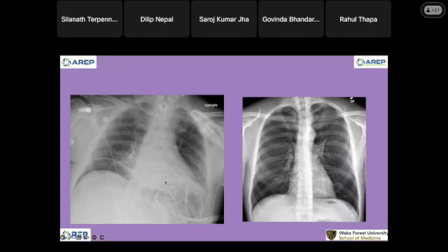There's no more left lung, and you can see the bronchial stump. A big air here. So this is our diaphragm, and then it's cut off. This is our diaphragm, and then there is air underneath the diaphragm in the belly. And the usual post-op left pneumonectomy. Okay.